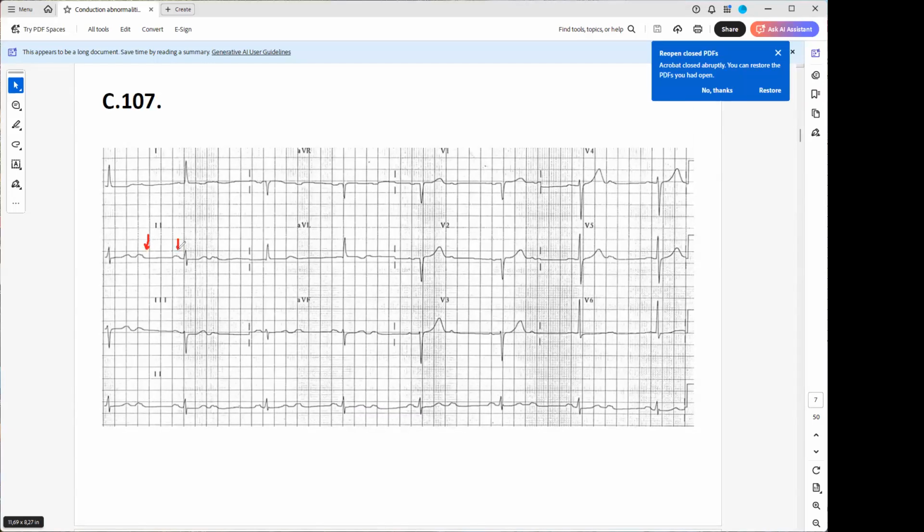So, sinus rhythm. This is a sinus rhythm. This is not a normal sinus rhythm. I can buy this one. But this is a sinus rhythm because in lead 2 you have positive and in AVR negative. It's true that the P wave is about the same.